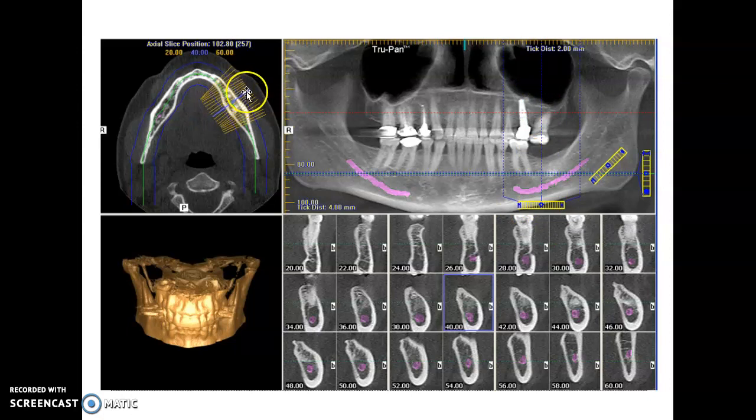This is that same area, and you can see it's highlighted in blue. If we were to click on another one of these squares, it would move the blue line within that scale or move it here. So these are vertical slices. This is a horizontal slice of this same computer regenerated view.